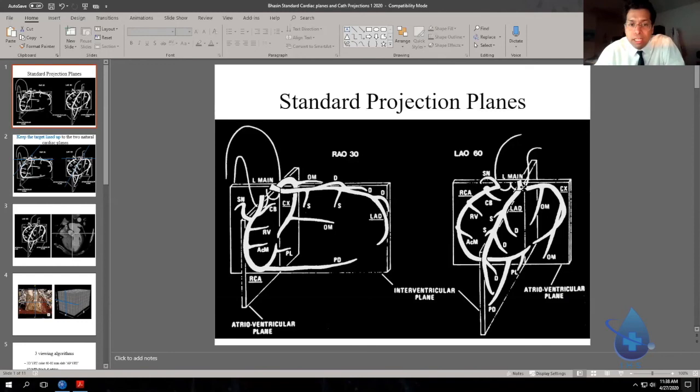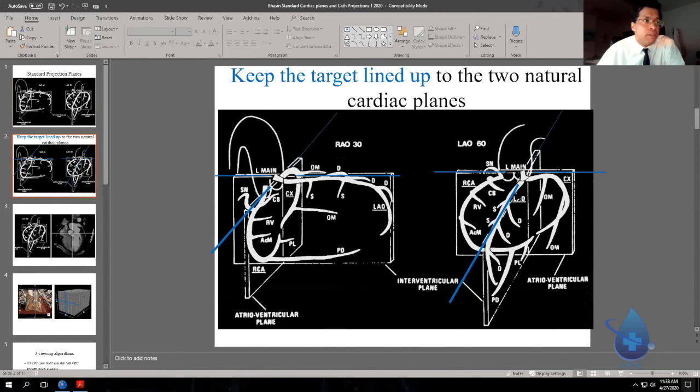So in vessel walking, the first step is to find the aortic valve and understand the left main usually takes off right beside it. So the left main and aortic valve are our home position, and we are continuously putting that into the center of the crosshair on the blue lines. And that's move one for orientation. And then move two is to make the AV grooves east and west along the blue lines and make the LAD north and south along the blue lines.